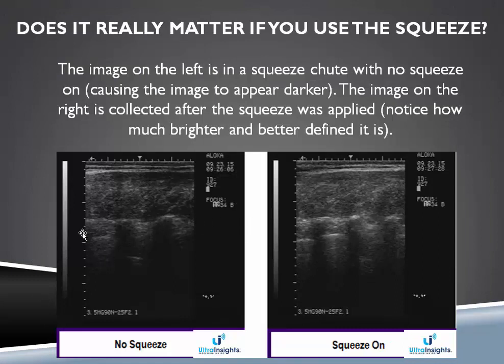So this is a sample. This is an animal actually that I collected the images on its certification several years ago. I don't remember how long. But if you look at the image on the left, we were talking about top fat line, bottom fat line, rib tops, and scatter. This image is darker, right? So you would assume this animal might be lower marbling.